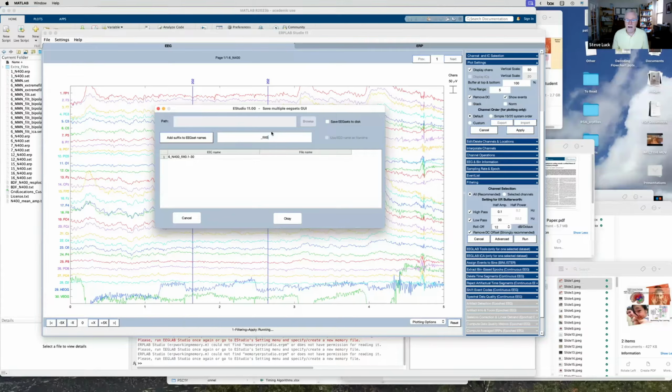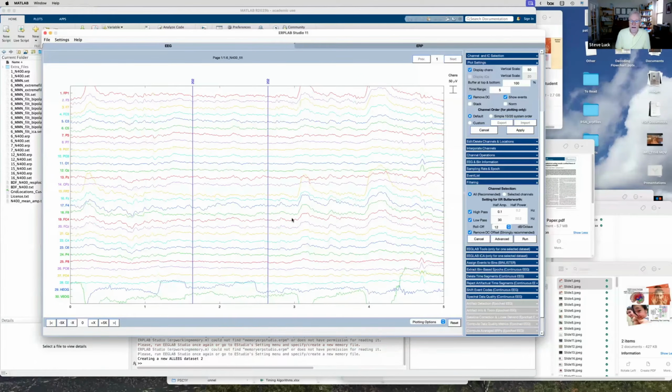So you can name it anything you want, but I recommend using our suggested names sort of as your default and then changing them to other things when you need to. Having defaults really makes it easy to know what you've done and look back at your previous data and know what it means. Okay, so we just click OK, and it's filtering and it's done.